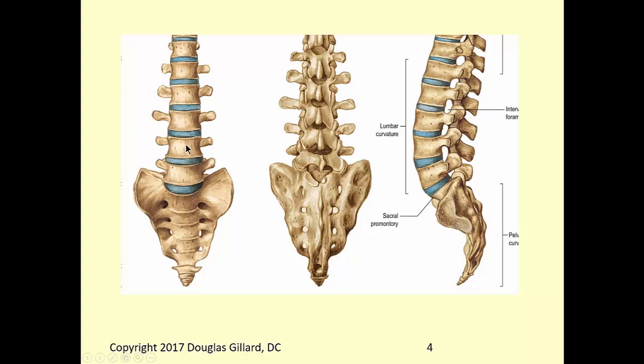What is a vertebra? Or sorry, vertebra is singular, vertebrae is plural. Vertebra, disc, vertebra sandwich called? I got you. Motion segment. This is a motion segment, the functional unit of the spine. This is the L3-4 motion segment. What disc is that again? That's the L3 disc. Okay, what's this? L5. L5 sits on the S1. Some people call it the L5/S1 disc.